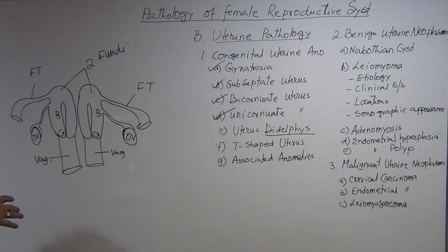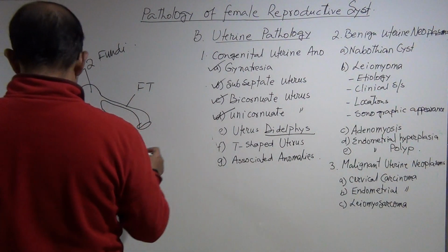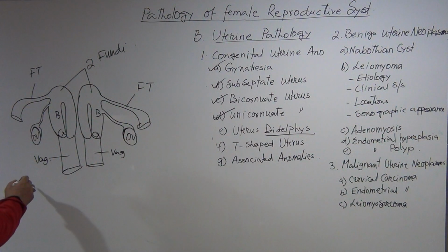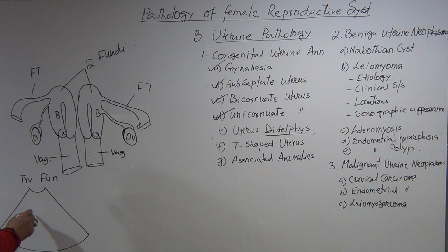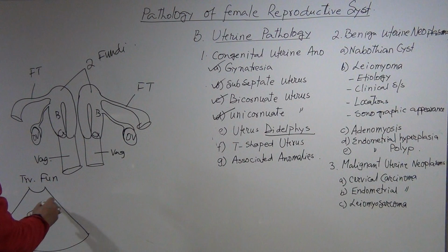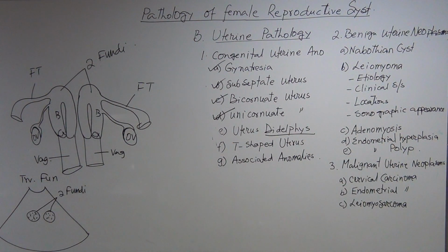So this is uterine didelphys. Sonographically, what we see for the fundus, let me draw the fundus first here. Transverse fundus. You will see two fundi.